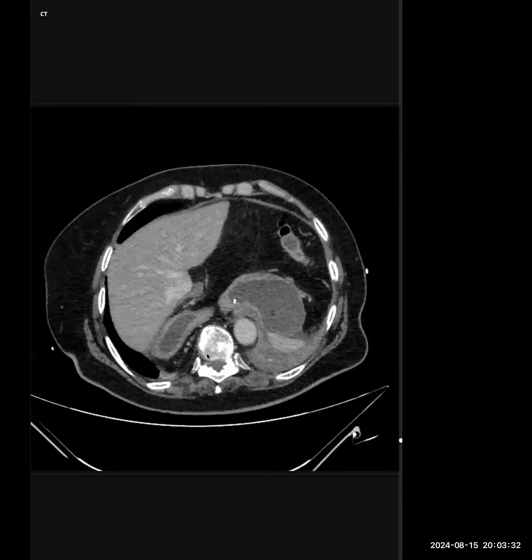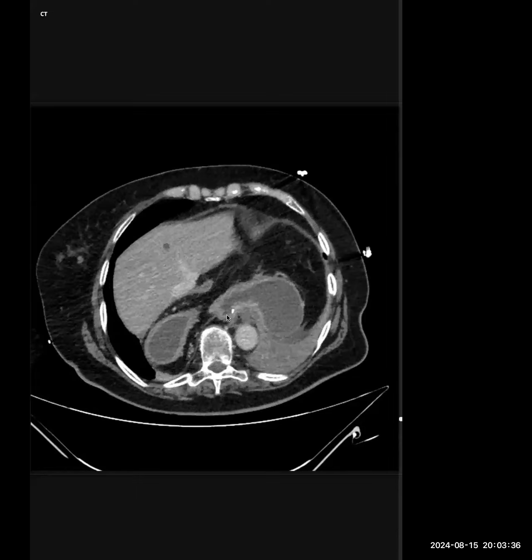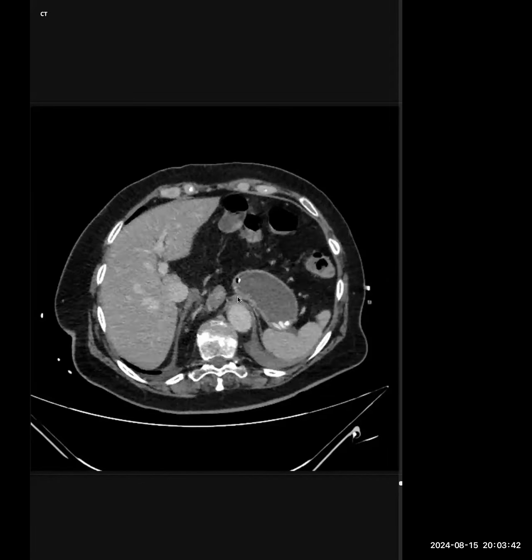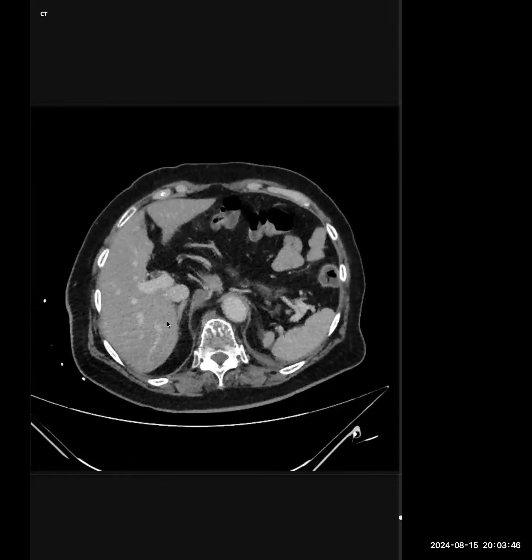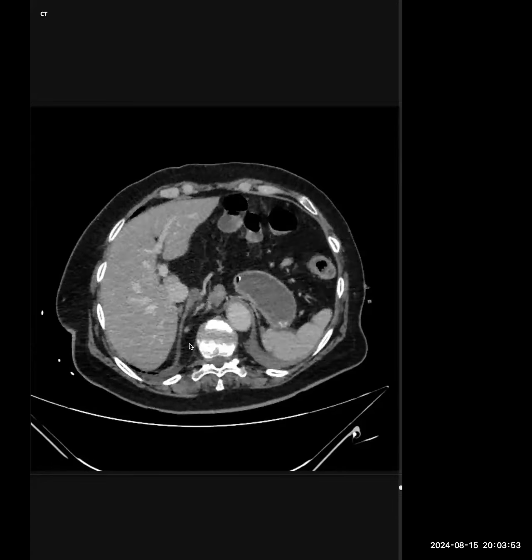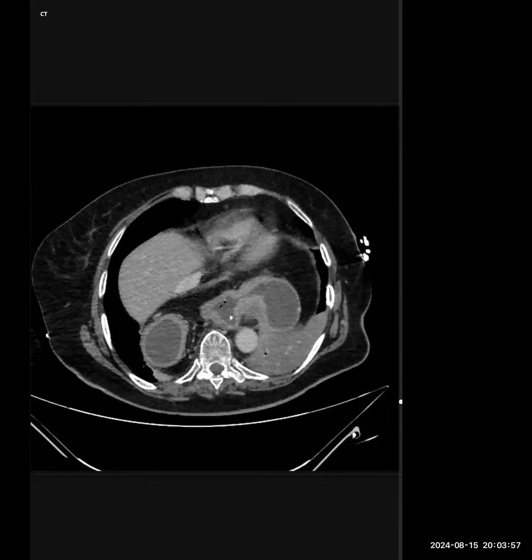So you can always say in my routine practice, I would review the coronal and sagittal, but based on the axial, you can trace the nasogastric tube and see that it is coming in under the diaphragm. Yes. So it is definitely not esophageal pathology, and then the rest of the stomach is going up. Yes, so it's a paraesophageal hiatus hernia, which can or cannot present with a volvulus. I agree. In this, I don't think there is a twist, but it could have.